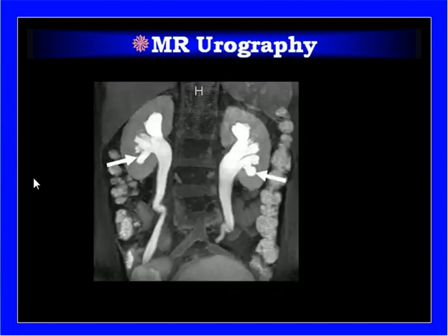This is MR urography. Again you can see different structures, and the ureters along with the dilated pelvic calyceal system, they are outlined, and the bright thing in the ureter is the urine. Now in case of MR urography, we need not give contrast to the patient, so we can see the fluid, for example urine in the urinary system, which appears bright or hyperintense. And similarly, if you look at the large gut in the periphery of this picture, you can see the gray scale. This is the fluid in the large gut mixed with the stool.